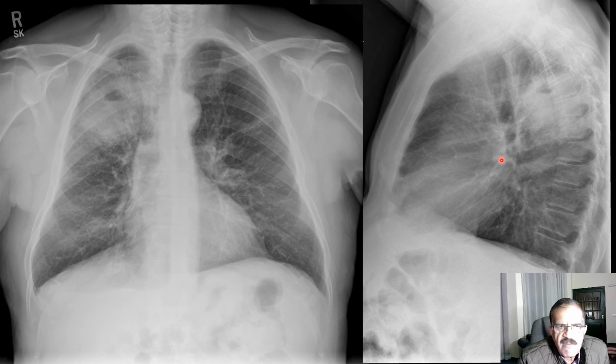There are some other features of lung cancer. I think I'm going to cover it in a separate lecture. But presence of calcification is a point against lung cancer. If there is erosion of neighboring ribs, a fracture of ribs, or infiltration of this tumor into ribs, that will be very suggestive of malignancy. In this case, I don't see any of those things, but it does look like a malignant process.